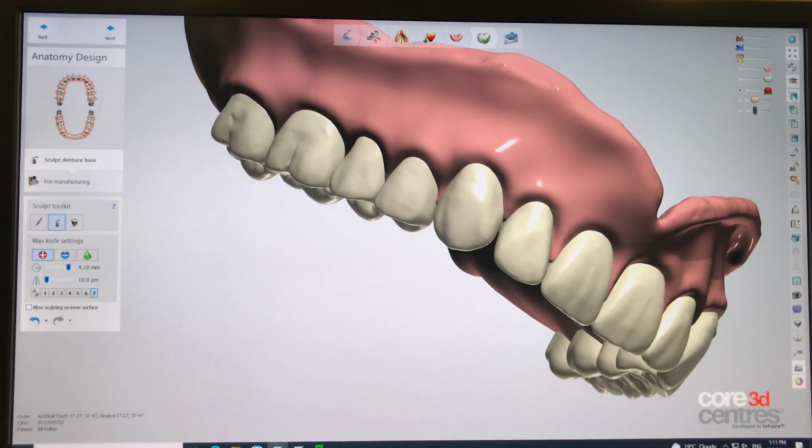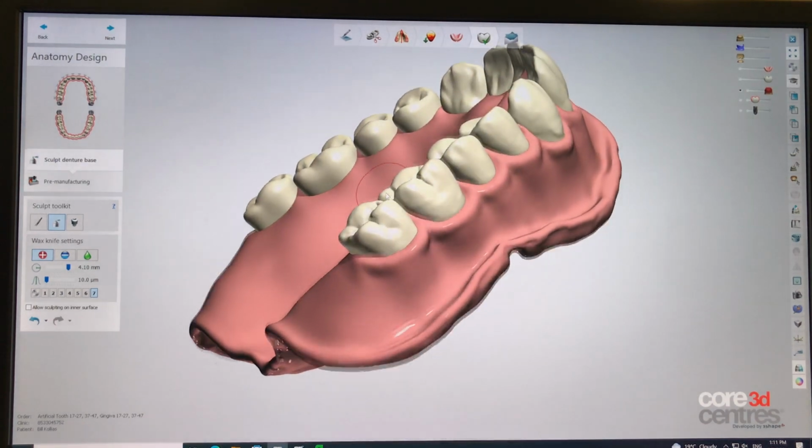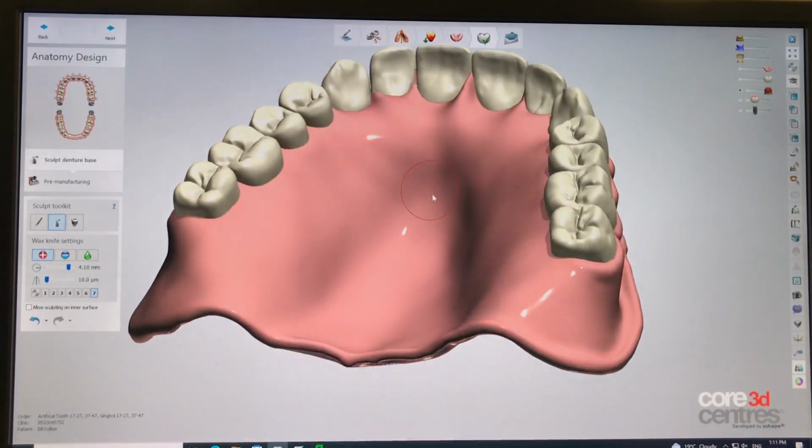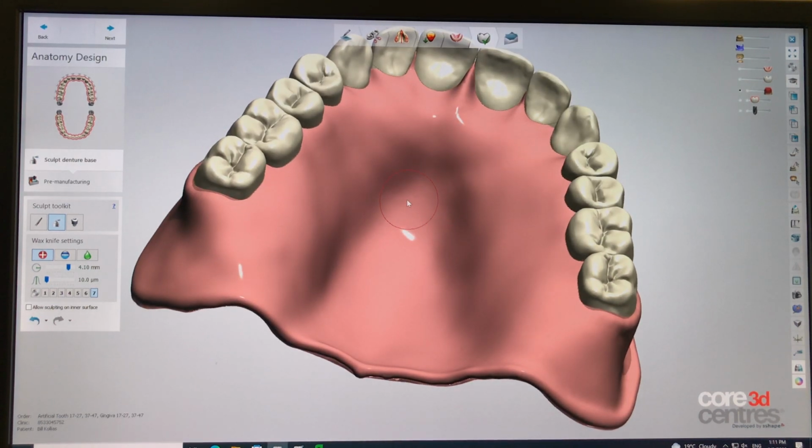So I think I'm happy with that. Not much to do on the lingual side. The software produces a very smooth lingual side that I'm not going to mess around too much. Possibly maybe select the smooth section here and just maybe smooth things out, but I don't see too much of a difference, so I would just leave it alone. All right, go back to my frontal view.